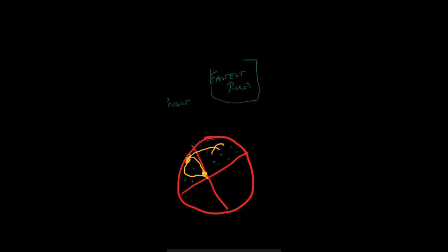rules. So if the fastest pacemaker rules, that means that this one starts firing maybe at 100. This next one starts firing at about a rate of 140. So what will happen is that they're bouncing all over the place. And that's why you start to see a difference in where these P waves are. And there are different morphologies, meaning that this one looks different than this first one. And this one here looks different because there's another one that's buried up in here.